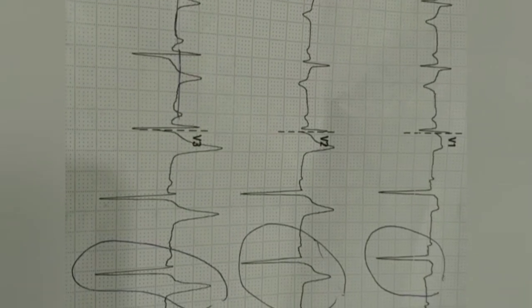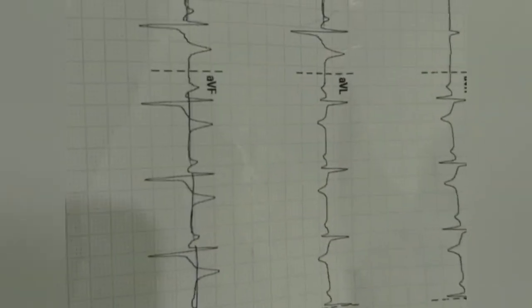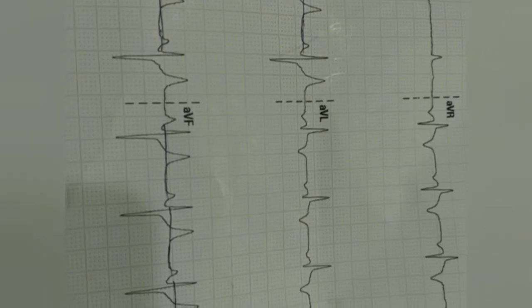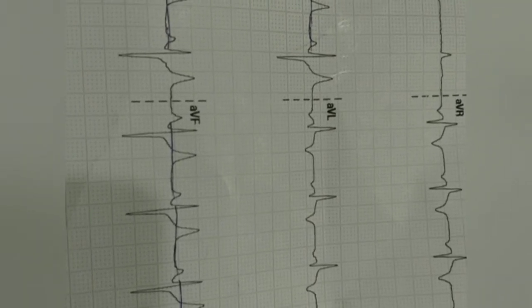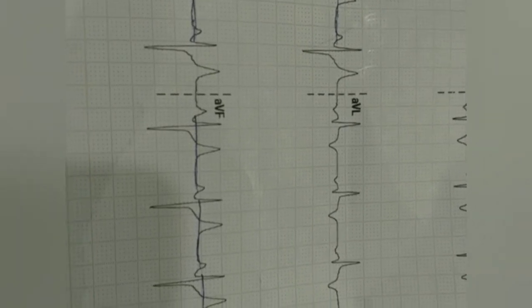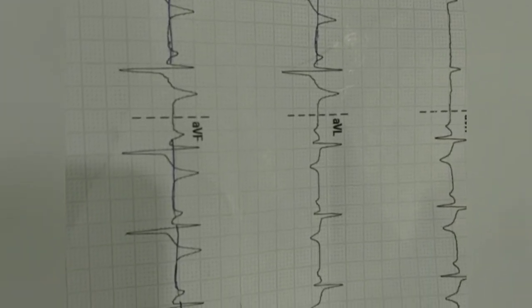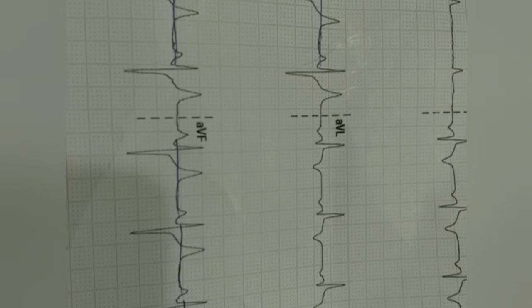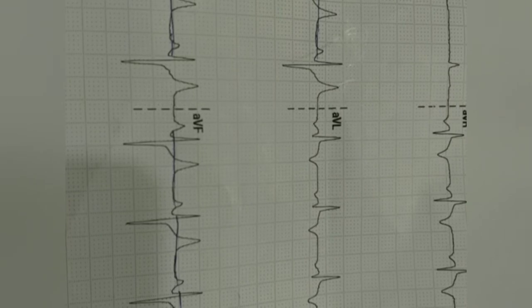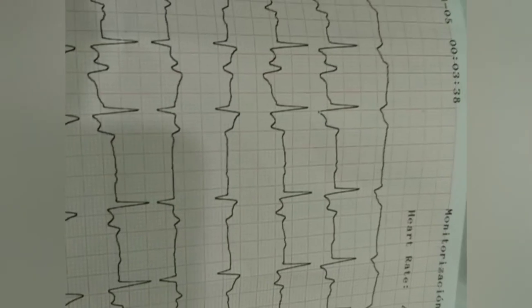Though sometimes the criteria changes for the chest lead V1, V2 and V3. Instead of 1 millimeter, it becomes 1.5 or more. 1.5 small boxes and more elevation of the ST segment. But in case of the other leads, it is 1 millimeter or more ST elevation. So here it is more than 2 millimeter or 2 small boxes in height. ST segment has gone up. So again, this ECG shows that this patient should be started on a protocol of acute coronary syndrome.